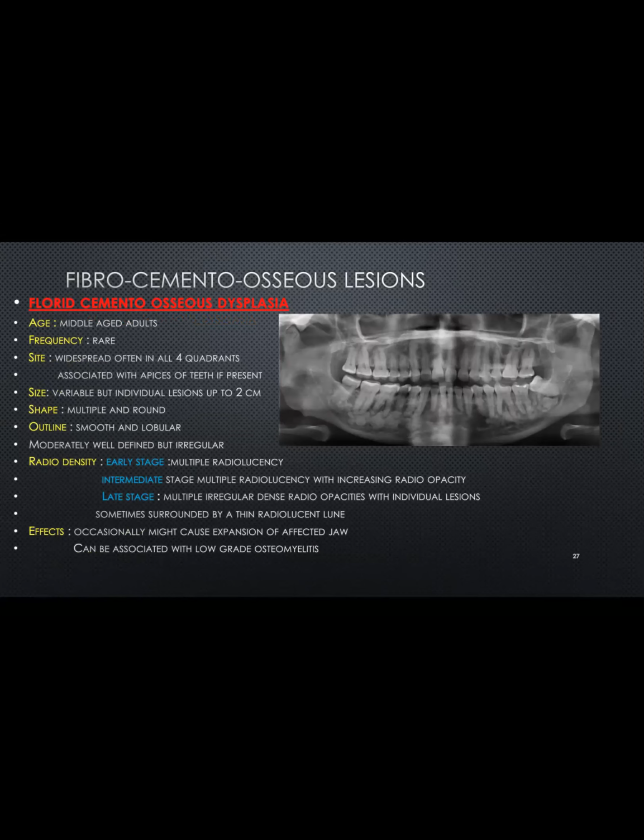Now the florid cemento-osseous dysplasia, it's really similar. It also happens in middle-aged adults, also affects Black women mainly, based on the studies. Now, the frequency is also rare. You could see that it's similar to the other x-ray, but this one has multiple ones of them all around the apices of the bottom teeth. Some of them are still radiolucent, but most of them have that opaque look. So they're basically almost the same.